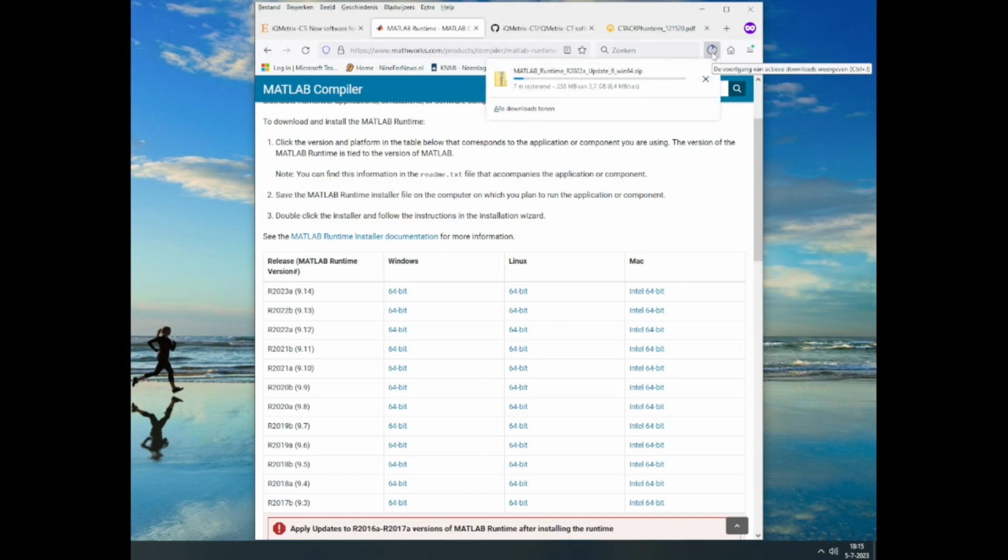Now it is running. This takes roughly 7 minutes. I will keep the recording up, and probably I will cut some part of the recording, so we don't need to wait all this time.